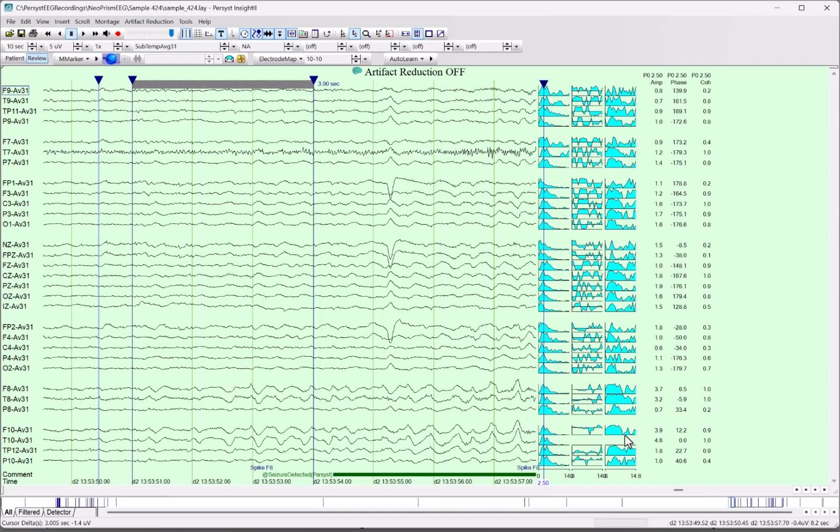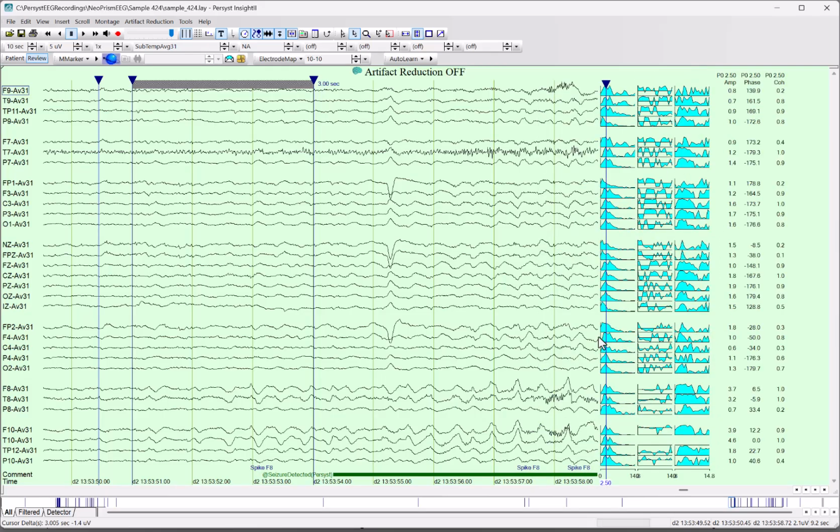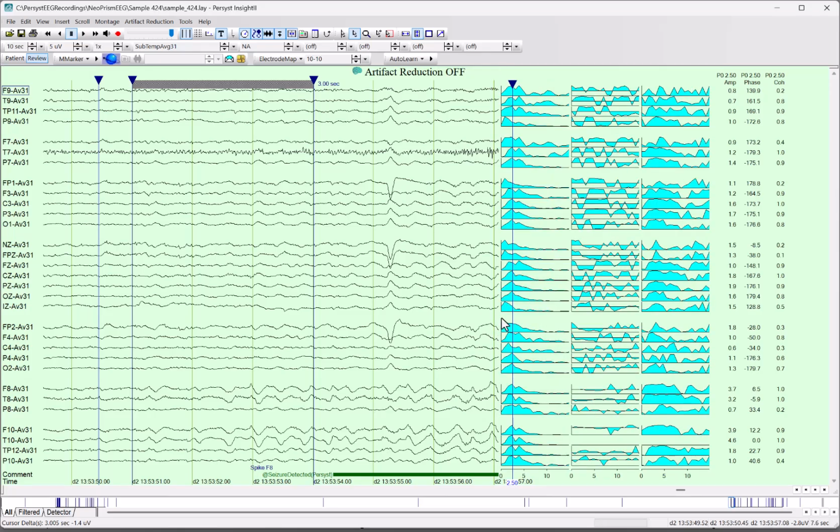You see these are getting a little compressed. Have a little space over here, keeping in mind that you can size the right or the left boundary of these just by putting the cursor between the two displays. It becomes a two-headed arrow. Just drag them and resize as you like. So let's place that second one.